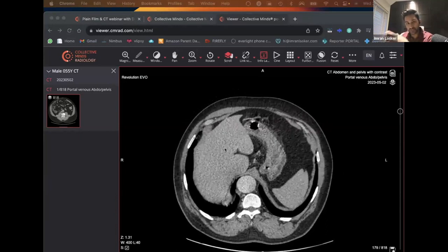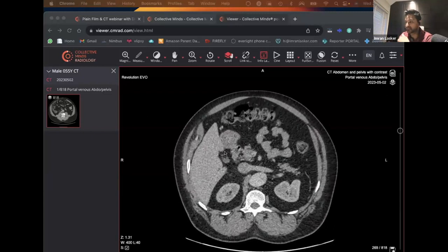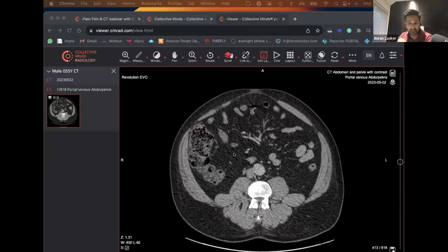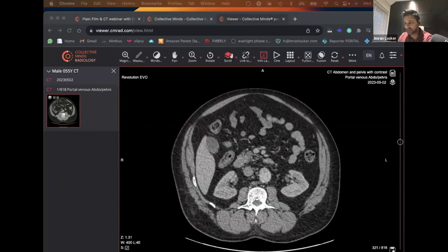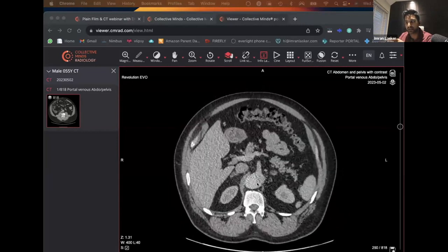something like this. The reason I brought this up is because at first glance, you think abdomen-pelvis. And if you don't have the vessels as your check area, you may walk away thinking, yeah, abdomen-pelvis normal, no abnormalities, no perforation, no ischemia, et cetera. But just being able to have a look at the aorta, or even having a look at the aorta to try and decide what phase of imaging you're at, can also help you.